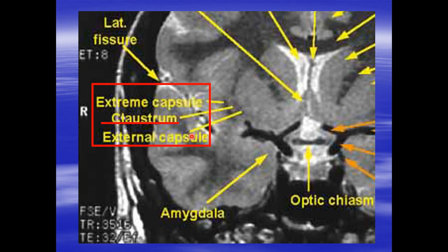and here we have the insula covered by the operculum, forming the sylvian fissure, and you can see easily here the internal carotid artery here and here, bifurcating into anterior cerebral artery and middle cerebral artery. Also the optic chiasm is very obvious here.